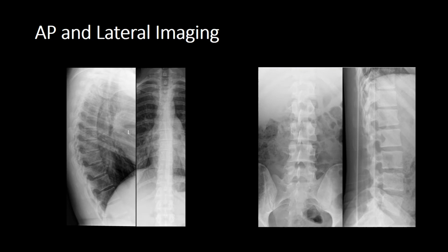Okay, that's good. Now you can go up 5, 4, 3, 2, 1. Now look for your rib. You need to do this every single time. Lumbarization and sacralization of the lumbar spine is very, very common. So you frequently get 6 lumbar vertebrae if there's been lumbarization, or 4 lumbar vertebrae if there's been sacralization.